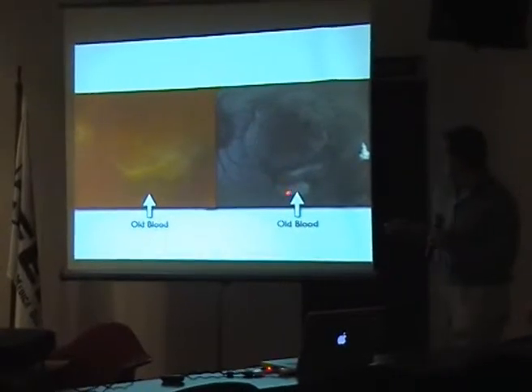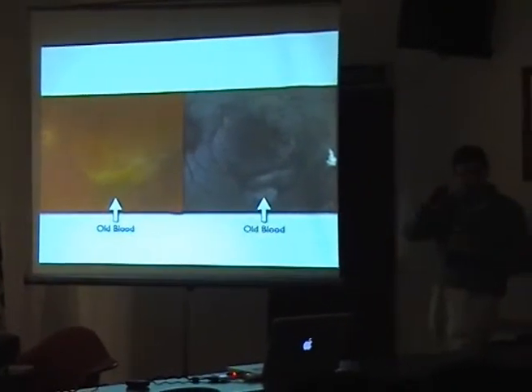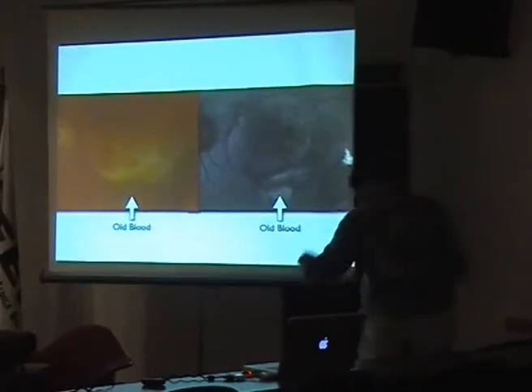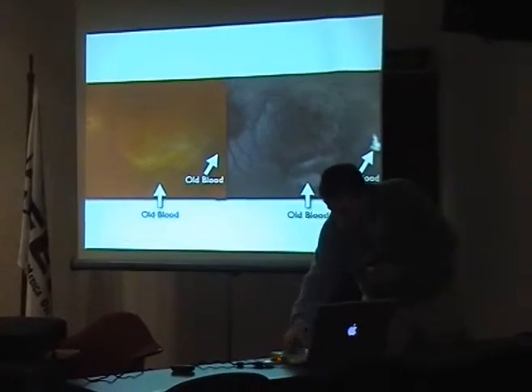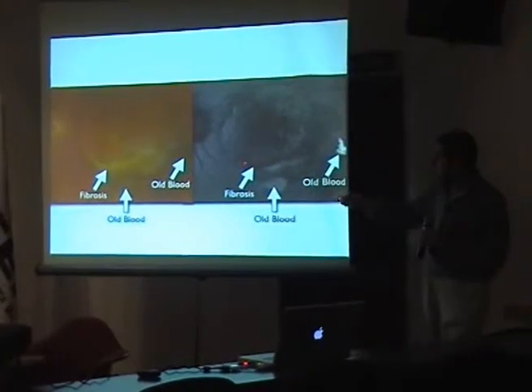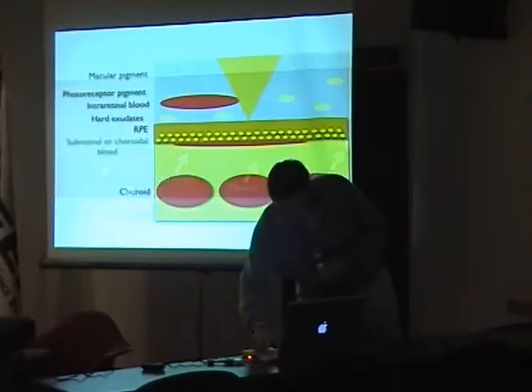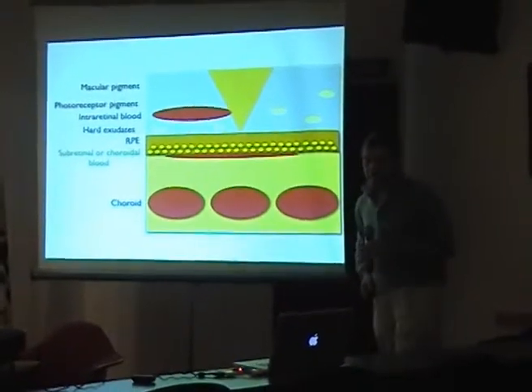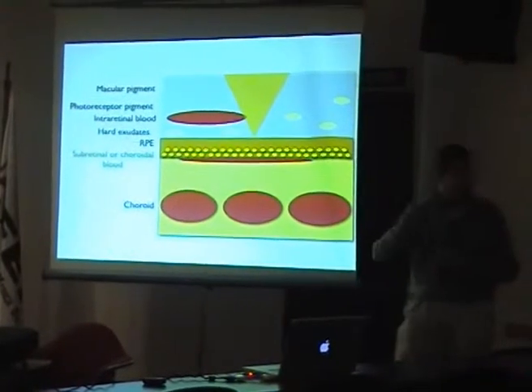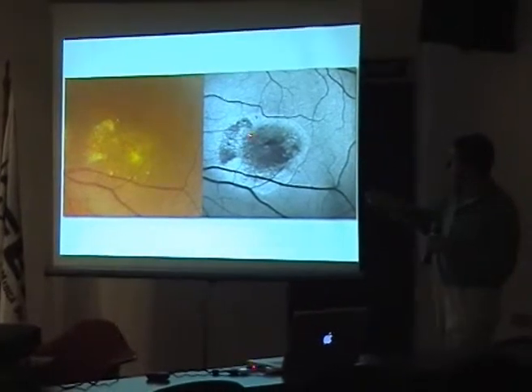That is old blood, fluorescent, and we will also see that there is other information about old blood with another fluorescence characteristic. Fibrin, that masks. Then exudate. Exudates are in the neurosensory retina. So you have such things.